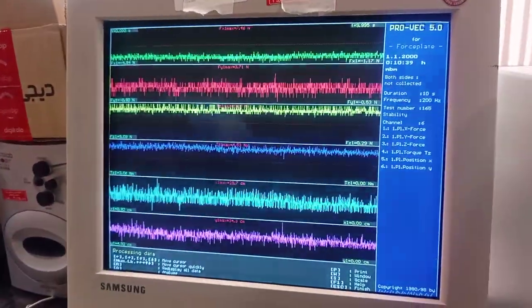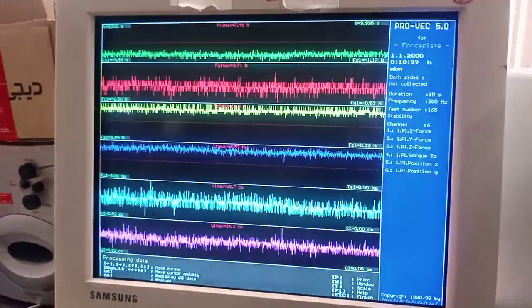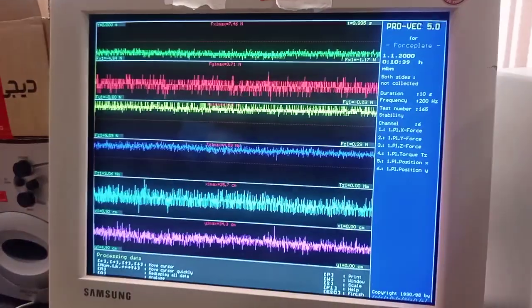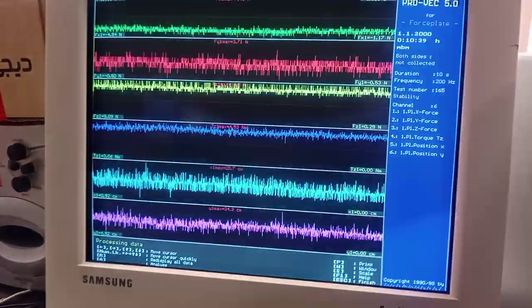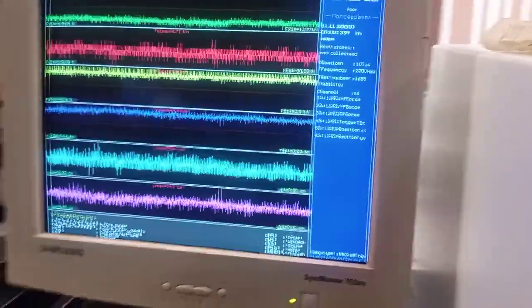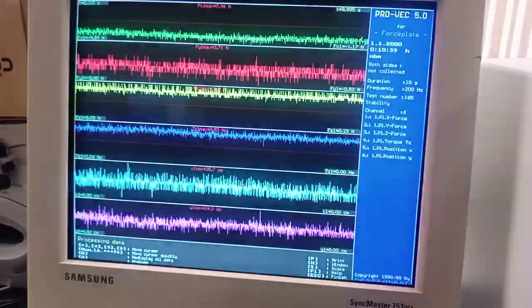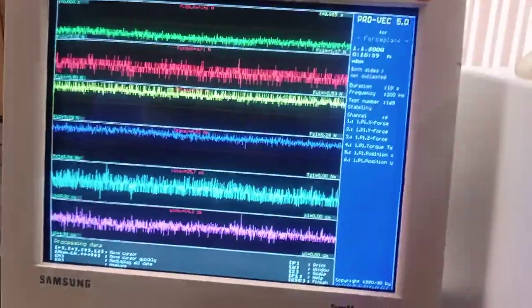So this is a graphical representation over time: FX1, FY1, FZ1, and TZ1 plus X1 and Y1. So these are all the axes, positive and negative, Z1 and Z, like this is upward and downward force and so on. I'll tell in a bit more detail what this means: anterior sway, posterior sway, medial sway, lateral sway, and then downward pressure or the no pressure.